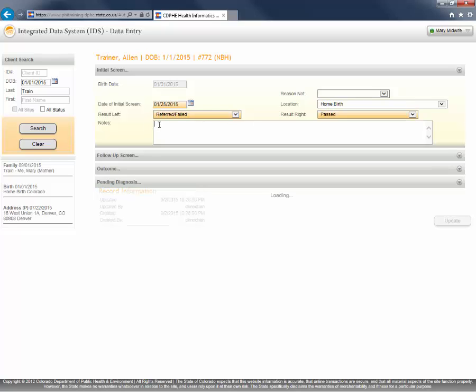The last thing that we ask that you do in this initial screening window is identify notes. By that we mean type in screened by, hyphen, and then the name of the practitioner. So we'll have it for our record keeping and queries.